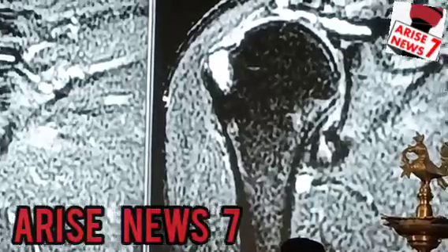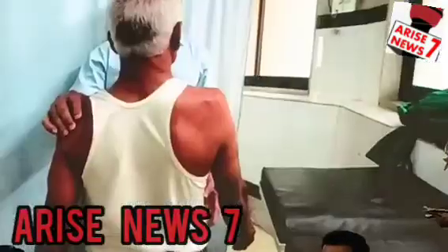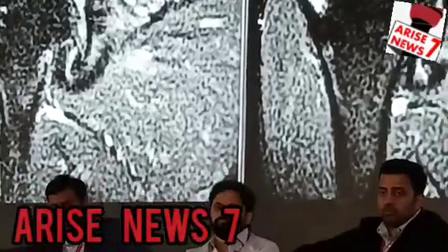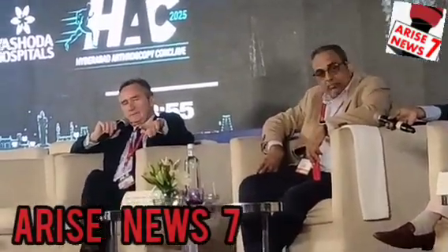So this is his MRI. Sorry, I think I showed this video. So this is his MRI. Philip, you can see a small cyst here and a full thickness rotator cuff tear. So what will be your advice? Can you show us the X-ray? Yeah, this is his MRI. X-ray again? Yeah, this is the X-ray.